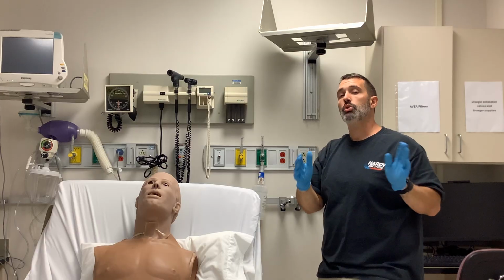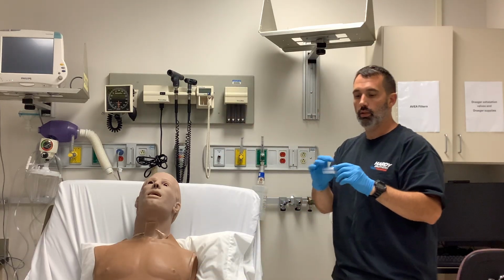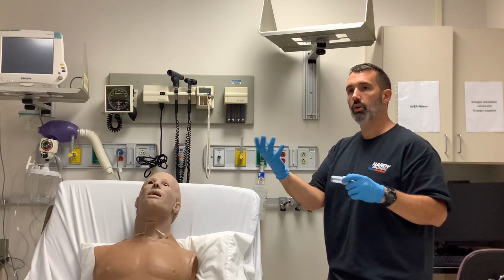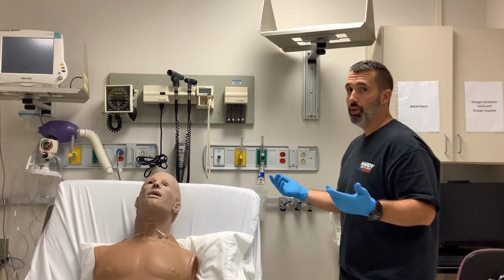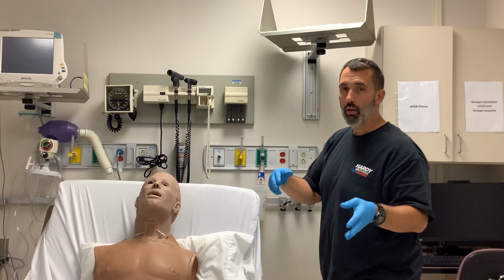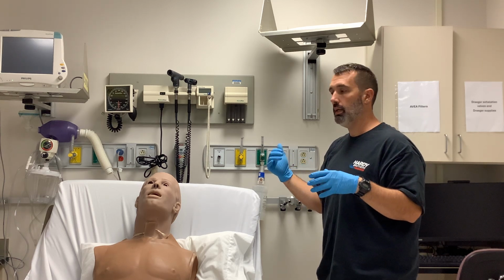So we've got to make sure that we meet or exceed the patient's peak inspiratory flow demand. That's why when we have stuff like these things that'll tell you to turn it to 3 liters per minute, 5 liters per minute, or what have you. Now keep in mind, the lower the percentage, the greater the pull of air is going to be. But I tend to always tell people, turn the flow meter up. Because the higher the oxygen flow, the greater the amount of air that's going to be entrained, but it's going to maintain that air to oxygen entrainment ratio at 40%.